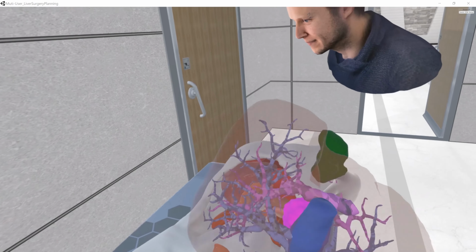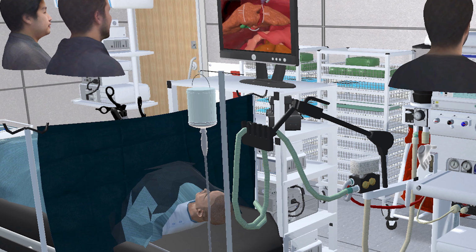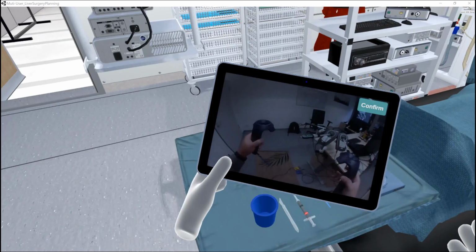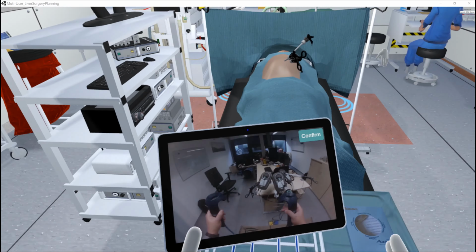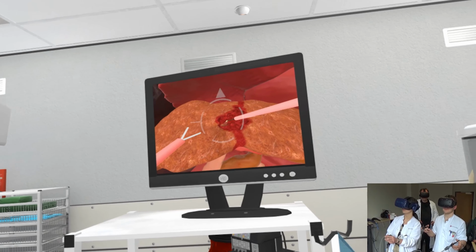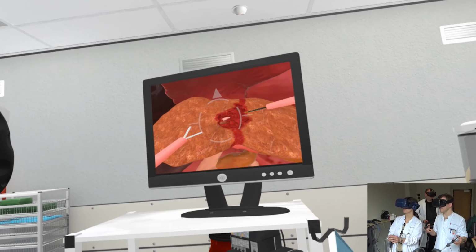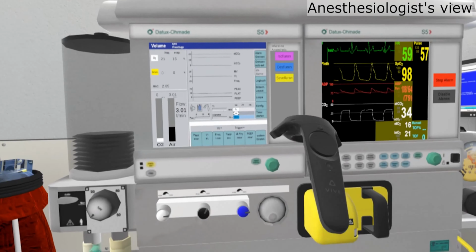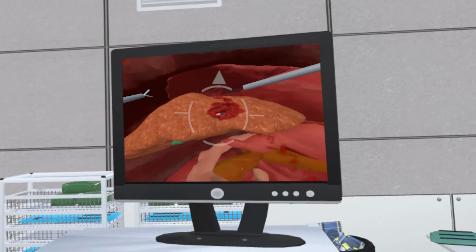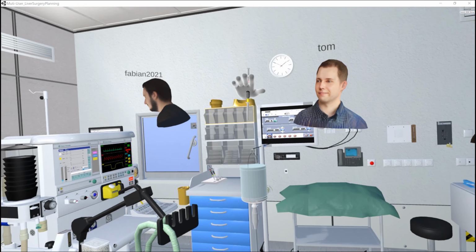The selected patient case in the planning room is connected, and also used for laparoscopic liver surgery training in the virtual operating room. We integrated a laparoscopic simulation with spatial input devices and training scenarios for interprofessional team training. This allows the users to perform the training with different user roles, including surgeons, camera assistants, and anesthesiologists. Therefore, they can train for critical and distracting events, where communication between each profession is necessary.